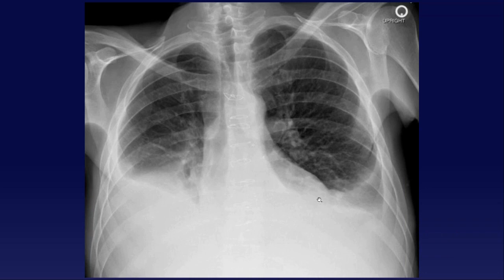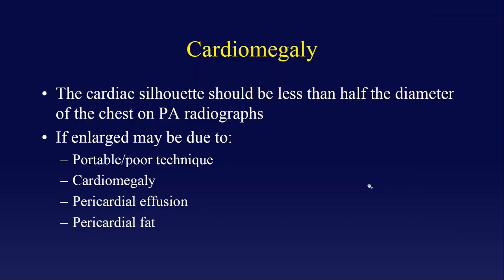So when you start seeing this peeking up at the edges a little bit, the blunting of the edges, that's very characteristic for a pleural effusion, okay?